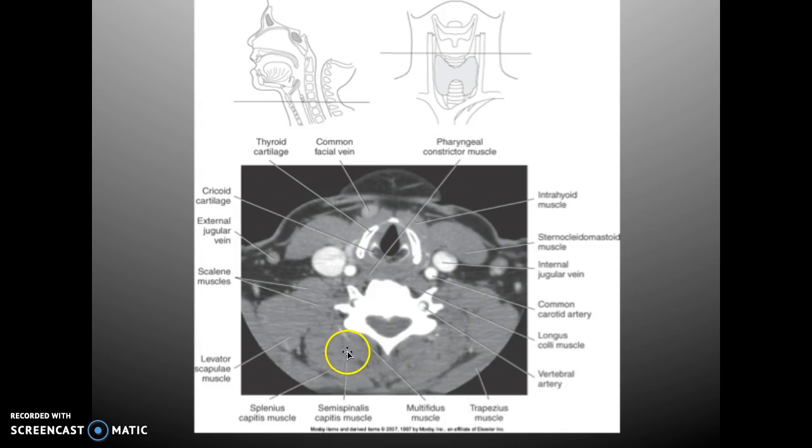And see how the muscles are all kind of going together? I wouldn't have you label that. You can see the levator scapulae right there, though. Your scalenes are hard to differentiate.